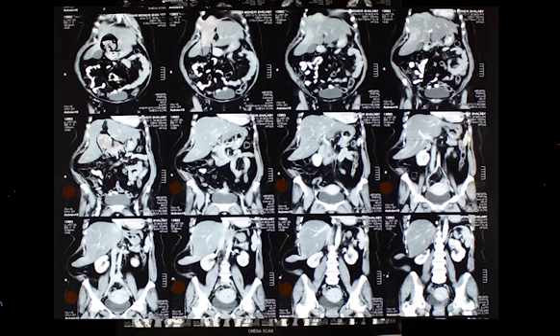We saw the air bronchogram. Who has something to say? Dr. M. Pradeep. Okay, go on, Pradeep. Doctor, in the first row, I was confused initially, thinking it was an MRI, because I cannot see the pelvic bones. I can see the rib cage, but not the pelvic bone. But in the second and third rows, the pelvic bones are clearly there, hyperdense. There's a gap in the body where the pelvic bones are not seen. You just see the lumbar vertebrae, but not the pelvic bones.